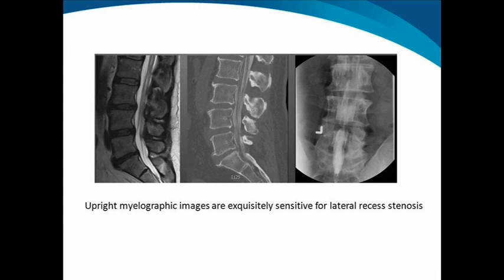The image that you're looking at in the center is roughly comparable to a sagittal T2 MR showing degenerative disc bulges but no significant stenosis. So if we stop there, we haven't really added much information above and beyond the MRI, although if this patient had a pacemaker, we've achieved at least an equivalent image. Here at the New England Baptist Hospital, we try and go one step further.